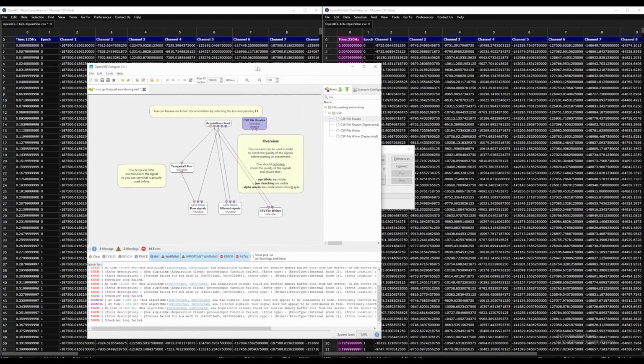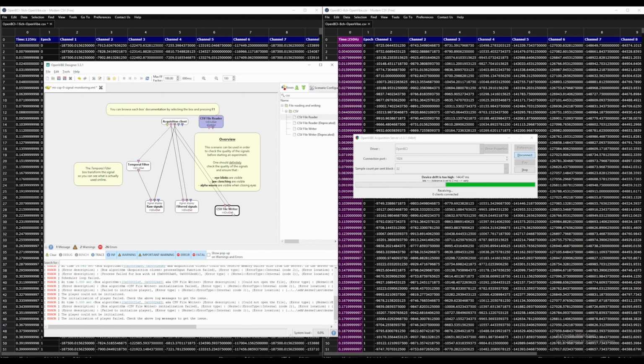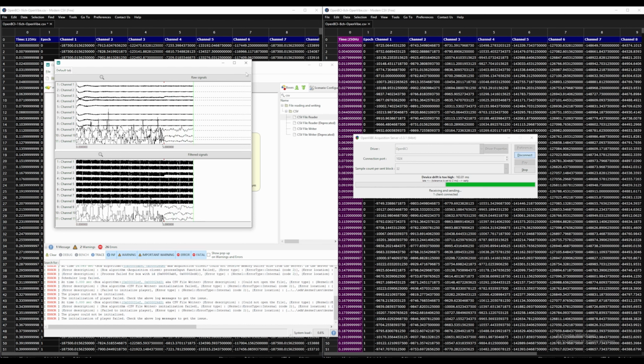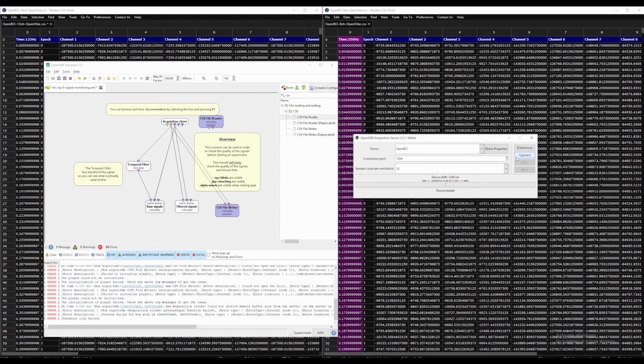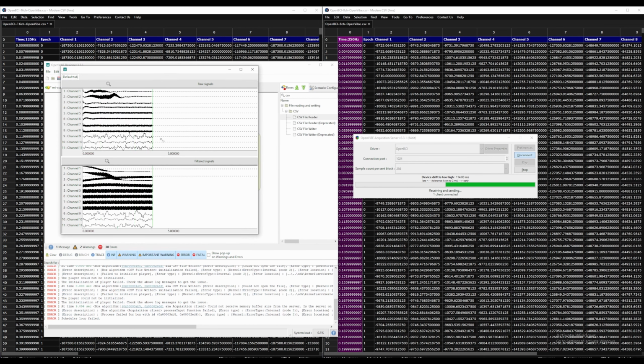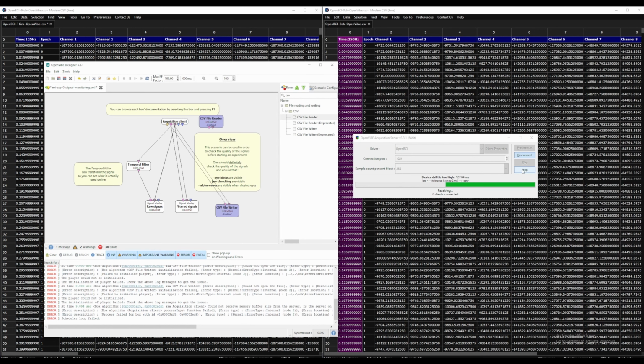You can actually see the chunks in real time. Let me connect again and play. Oh, it's trying to overwrite the file. Let me disable this box. All right, now it's not writing to anything. So yeah, you see that the data is not coming one by one sample. Well, let me maybe use a larger block. Let's say 256. Right, now you see it's coming in larger chunks. And that's just how OpenVibe is designed to work.